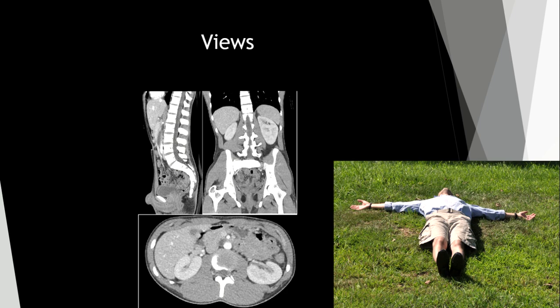We have three major views. This is the most standard view, the axial view.